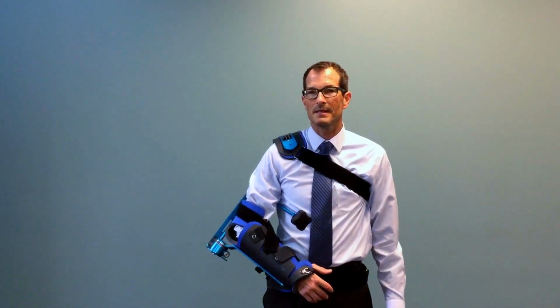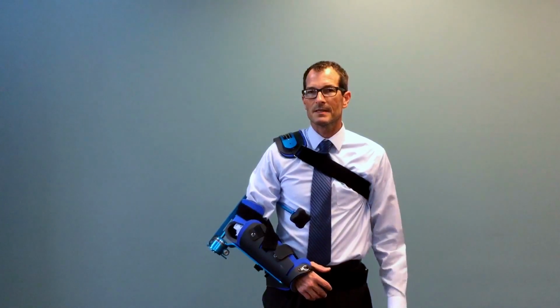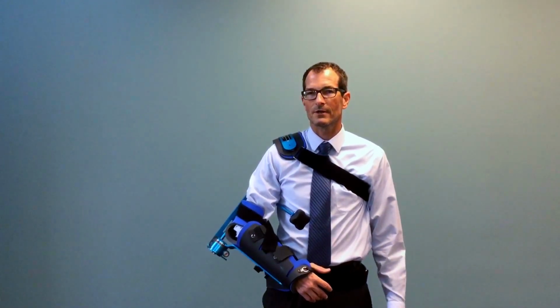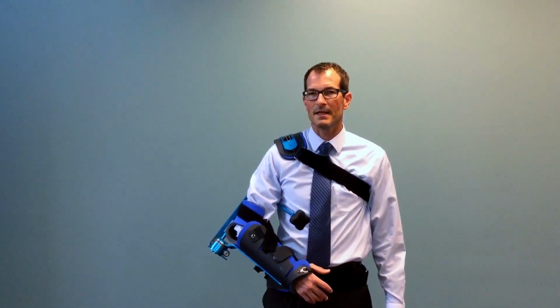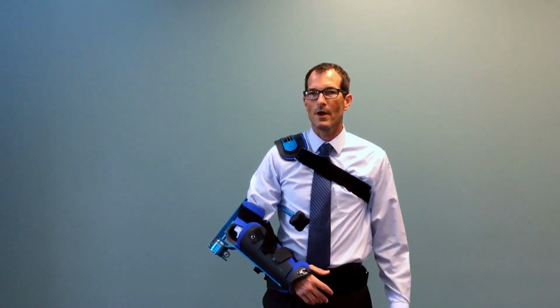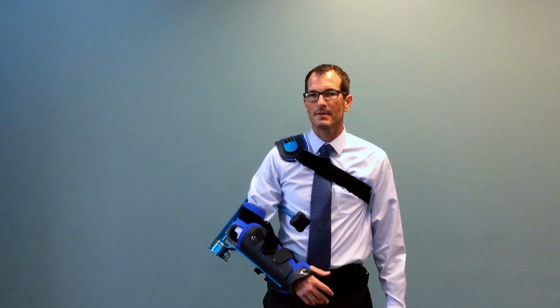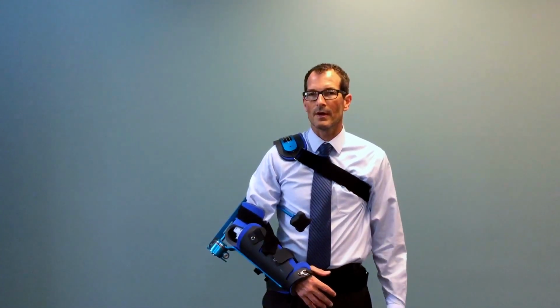Today we're going to be discussing the Stat-A-Dyne shoulder device by Lance Medical. The device was designed to address adhesive capsulitis in the shoulder, which can occur a variety of different ways. There's primary or insidious adhesive capsulitis that occurs for unknown origin. And then there is secondary adhesive capsulitis that typically occurs after some type of surgical procedure or insult to the shoulder.